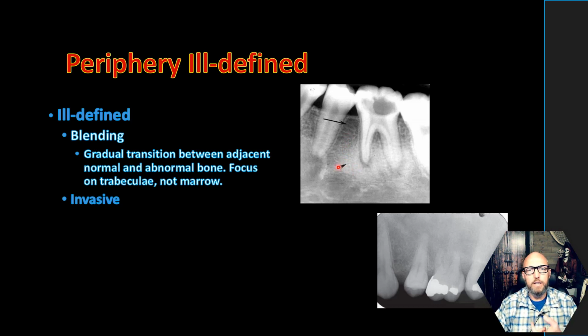I said typically malignant or an inflammatory process. So that inflammatory is the big exception to that. Another one might be what we see right here.